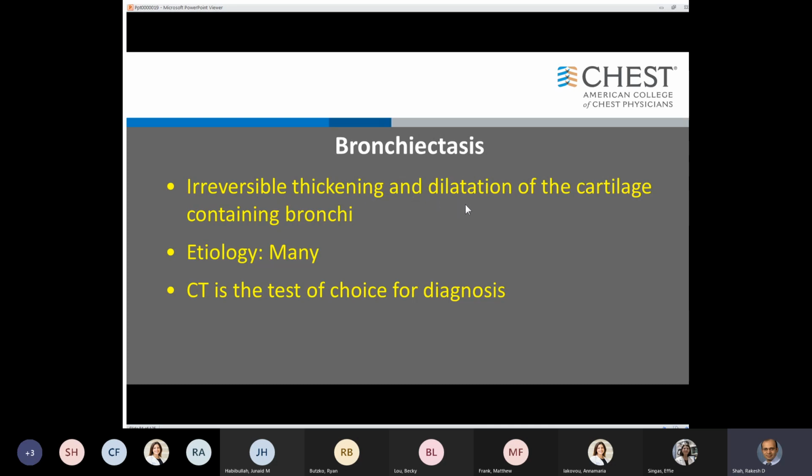In an acute inflammatory process, the airways may transiently appear thickened and dilate. And in the literature, that's been called pseudobronchiectasis, or best not to say anything. But once the process resolves, and if you do the scan and those airways have not returned back to normal and they persist as dilatation, then you can certainly call them bronchiectasis.